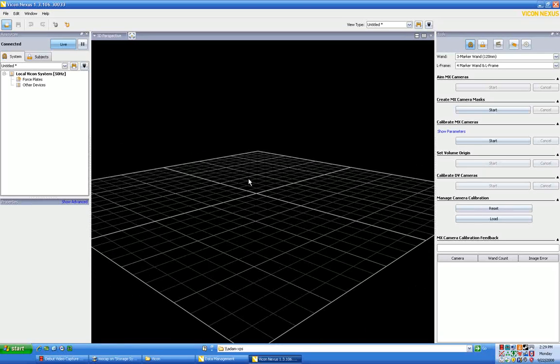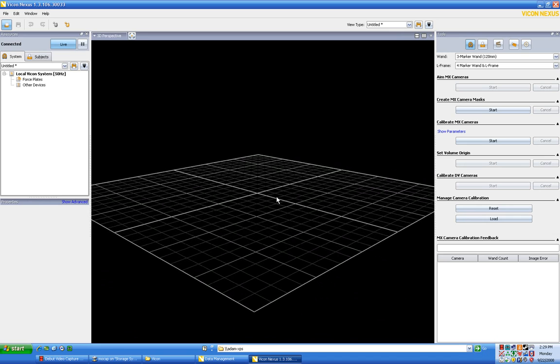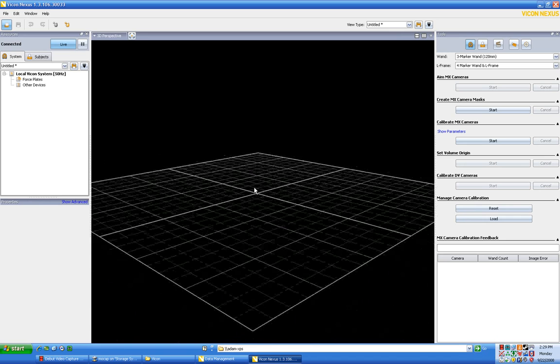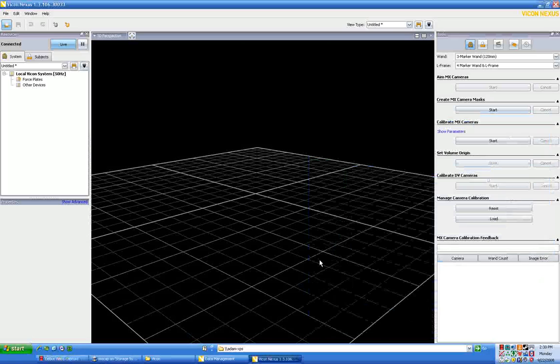Now, if we hold the right mouse button in and go down or up, we zoom in or out. If you go left or right, it doesn't really do anything while holding the right mouse button. It just zooms in or out when you go up or down. Okay, so that's how our three-dimensional navigation works.